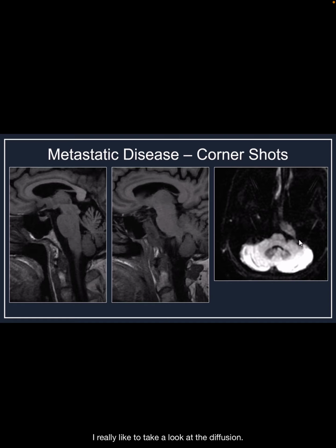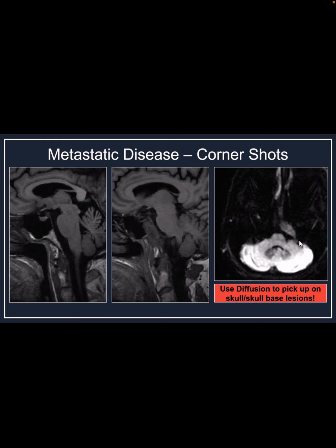I really like to take a look at the diffusion. The diffusion can be quite helpful at picking up lesions within the skull base. You can see in this example how the lesion is kind of off midline, maybe indicating that we should be paying attention to that area.